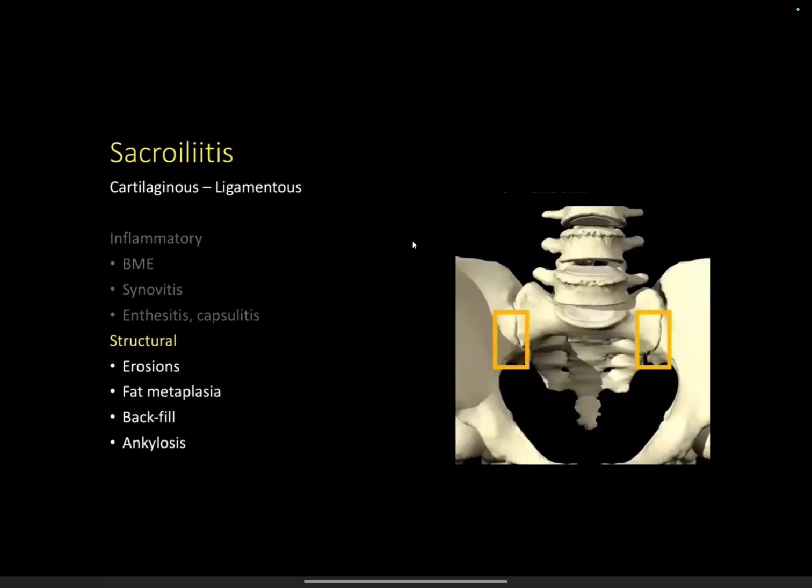As we have discussed already, it is usually seen more commonly in females postpartum. So females postpartum is one clue. You see sclerosis, but now there is an acute phase or an active component of the disease as well. So when it is present, then you see edema.